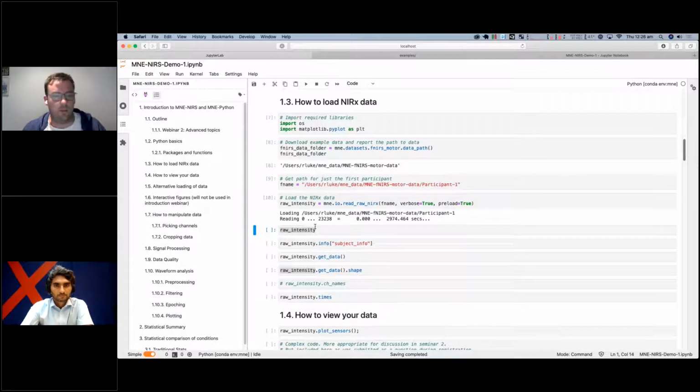For those of you who don't know, BIDS is a common format for how to store your data, but not the file format like SNIRF, but more what folders to put it in. And if you've watched the NIRx tutorial about the NIRS toolbox, you have to have a very specific hierarchy for your folders, and this is a standardization of that, so that all the different software toolboxes could use the same folder hierarchy. That's what BIDS is.